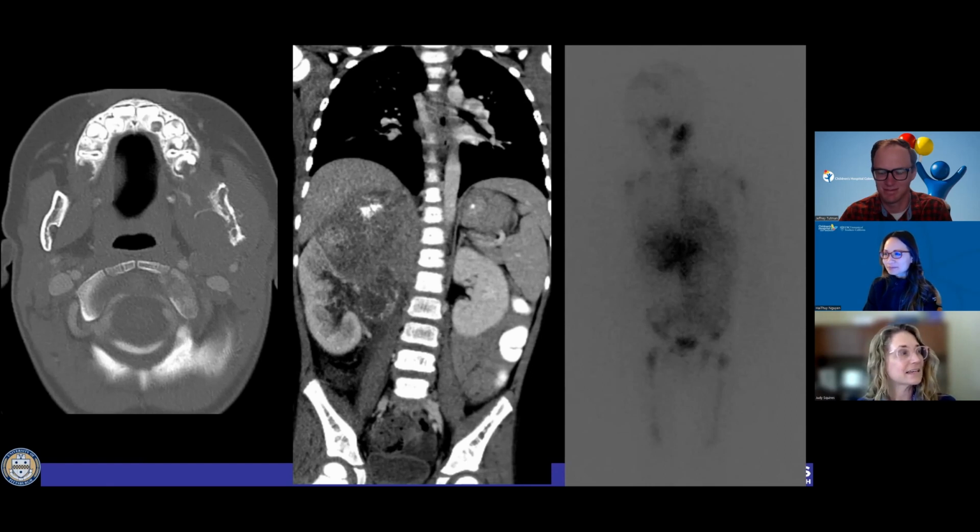Yeah, this kid, because of his limp, actually went on to pelvis MRI first. So there was a little bit of a delayed diagnosis just because of the way he presented. And we've had several cases where in the back of my mind I'm like, is this neuroblastoma? And of course it ends up being neuroblastoma. I just wish I would have gone and found the primary mass right off the bat. Of course, that's when it's me scanning, not a tech just ordering something or adding something on rather.